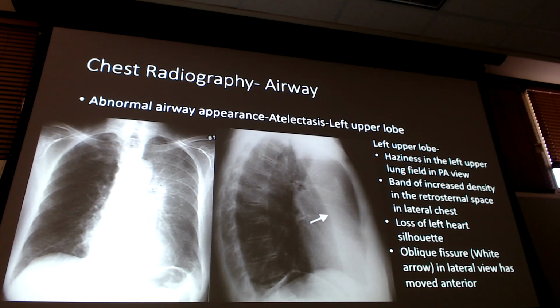Can we see that one there? How do I know it's an atelectasis? Again, I see that. What's my patient presenting like? I don't have any illnesses, but we haven't had a pneumonia that has crossed lobes necessarily yet. Right? Can you have multilobular pneumonia? You can. Yes, sir. So can you just outline the lobes one more time?